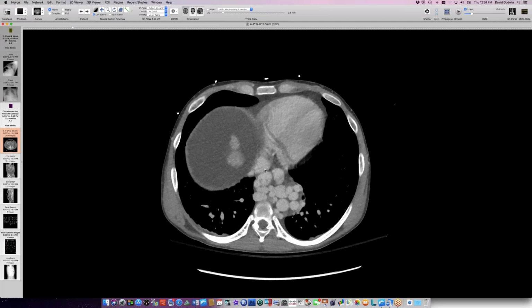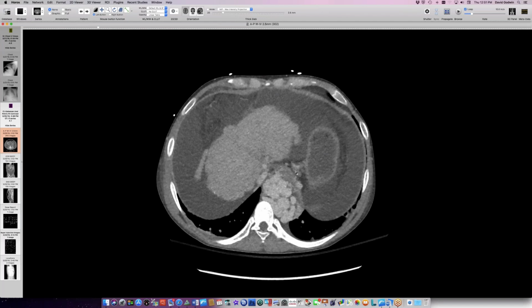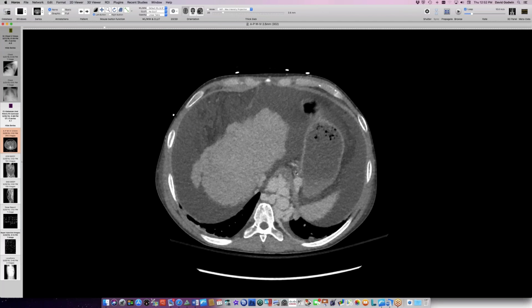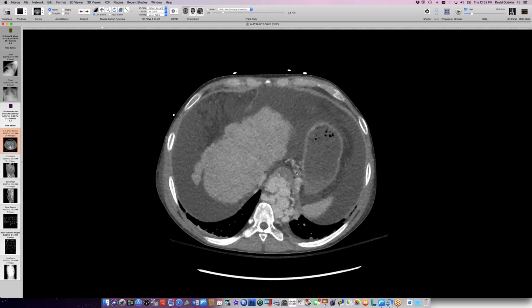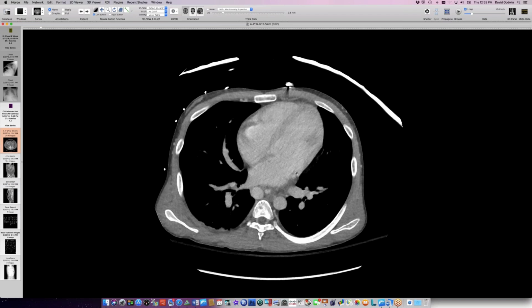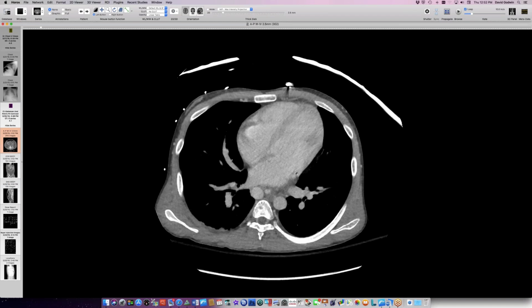So I don't know, what do you guys think? Do you think the cava is being compromised by this liver here? I think it must be, because the contrast is fairly bright when it's opacified. Sure, looks like. Okay, I don't know. Have you ever seen a dilated azygous in association with varices before? We know varices will do strange things like communicate with inferior pulmonary veins. Any place to drain is legitimate when you're a distended vein. You'll take anything. I didn't see that in this case.